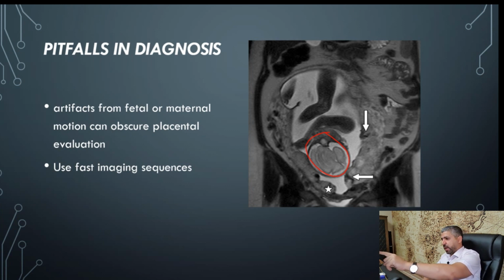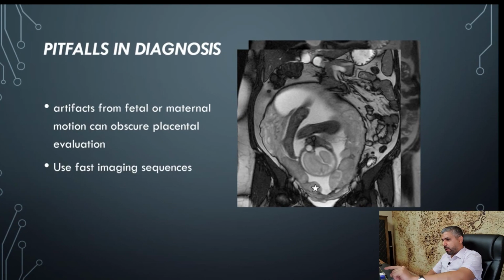So we can see here the placenta, obviously, and we can see loss of the myometrium, and here possible invasion of the posterior soft tissues. Another example here, you can see this is a very nicely demonstrated placenta, and we can see the diffuse thinning of the myometrium and loss of the three-layer appearance. It has some lumpy areas here and there, so also suspicious for placenta accreta spectrum.